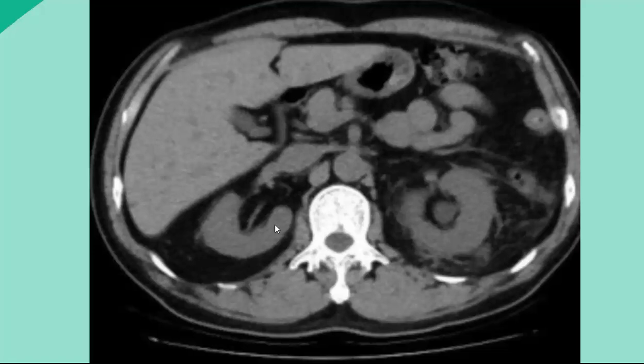Here's an axial CT. The right kidney looks absolutely fine. Look at the fat renal parenchyma interface. It's clear, it's crisp. Here on the left we can see hydronephrosis by dilatation of that calyx. And look at all the stranding around that left renal cortex. This is a sick kidney. It probably requires decompressing very quickly.